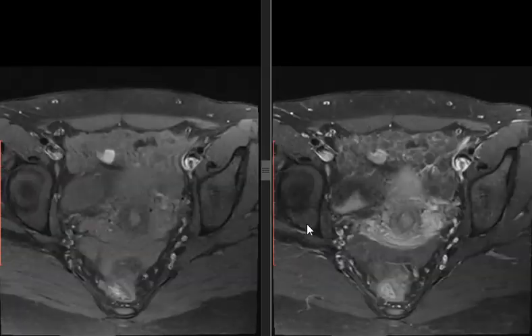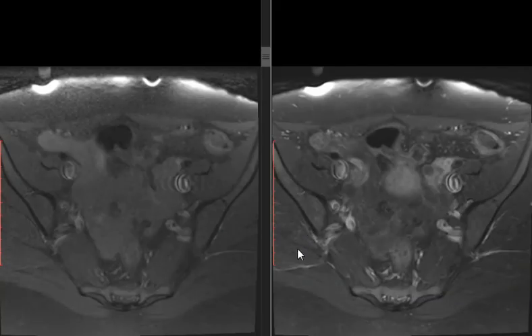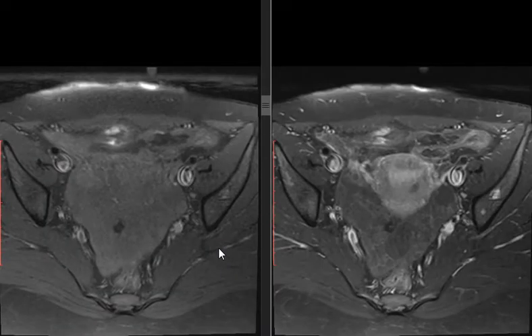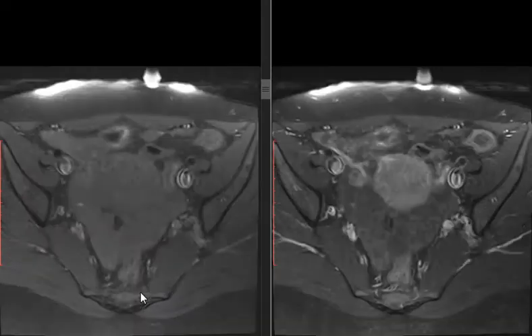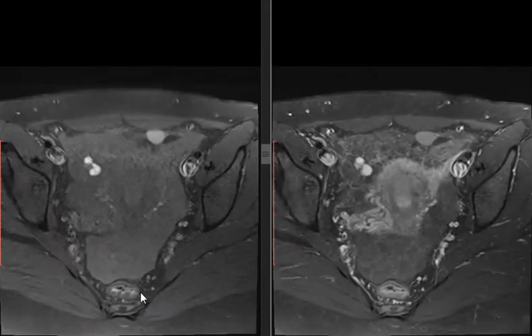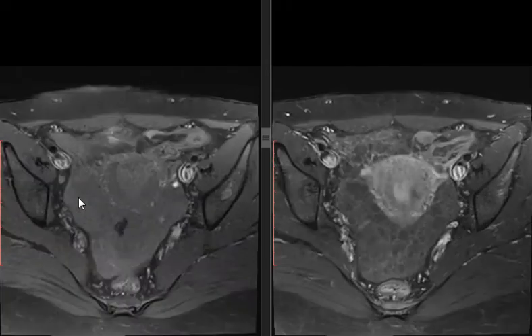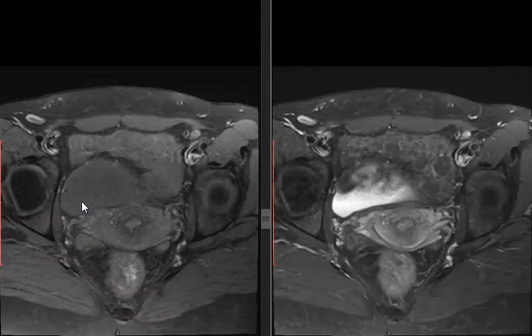The mass is hypo in T1 fat sat. Okay. And it's mostly fatty. Also, we don't have normal T1 to be sure. But also fat can't be high in... Well, let me help you with that. It's not fatty. It's more of a fluid. Okay. Ugly, bubbly, exactly. Multicystic fluid. So it's hypo in T1 fat sat.